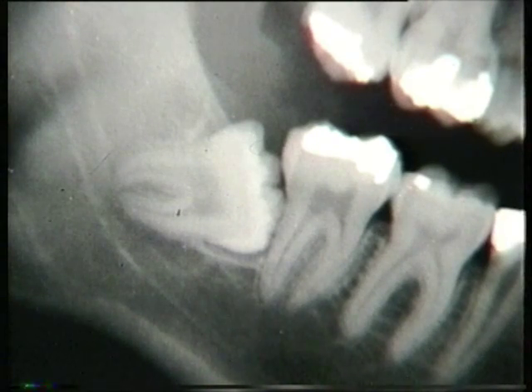Now for the third molar itself. The crown is of a size similar to the second molar, is multicusped, and is intact. The follicle space surrounding it appears somewhat widened just below its mesial surface. The roots, of which there are two, are separate and curve towards each other apically. The mesial root is thinner than the distal, which is slightly bulbous.